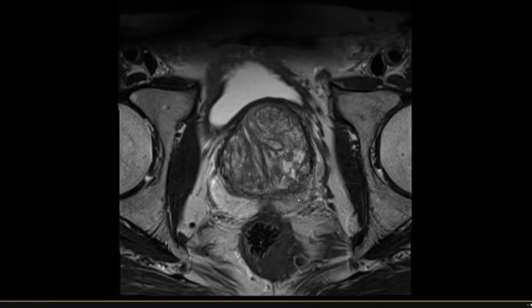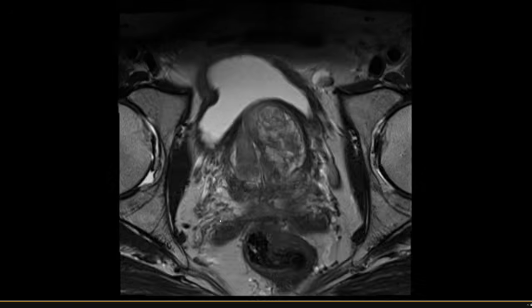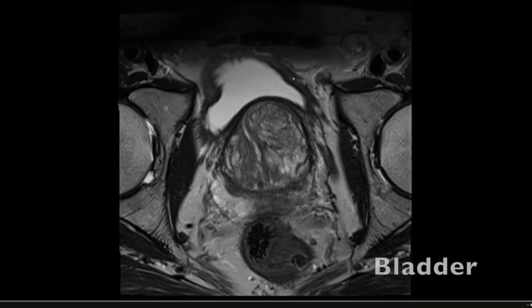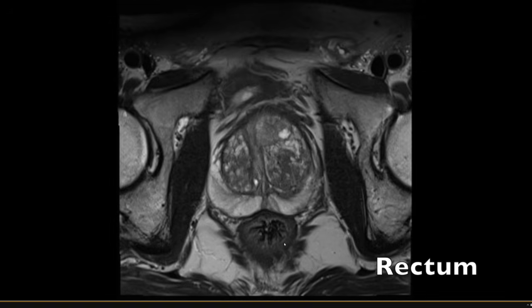Other anatomy that I want to point out on the sequence includes the seminal vesicles here. So we have the right seminal vesicle here and the left seminal vesicle over here. The neurovascular bundles run at the 5 and 7 o'clock position along the prostate and enter the prostate at the base and the apex. So those are potential areas of extraprostatic extension. This here is the bladder. So this is urine here, and this is the bladder wall. That's pretty T2 hypointense. Back here is the rectum.